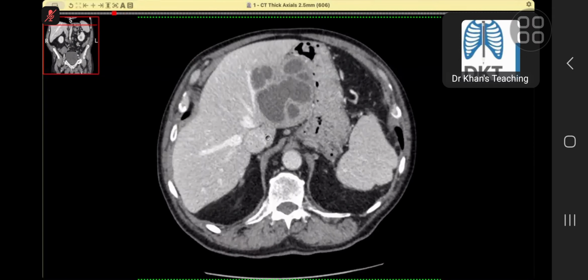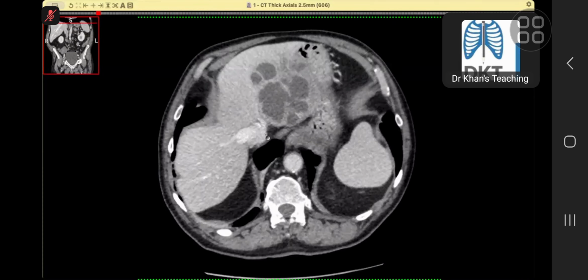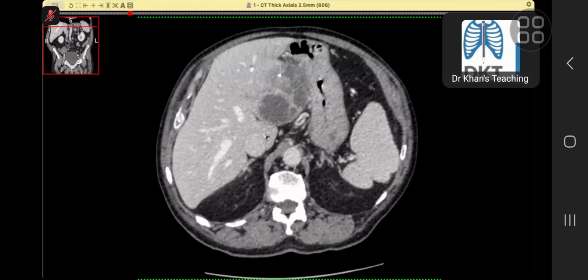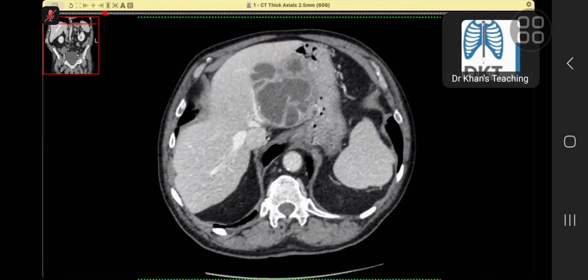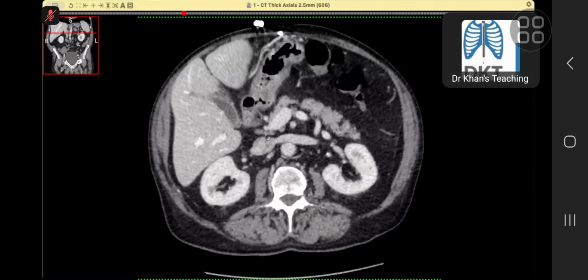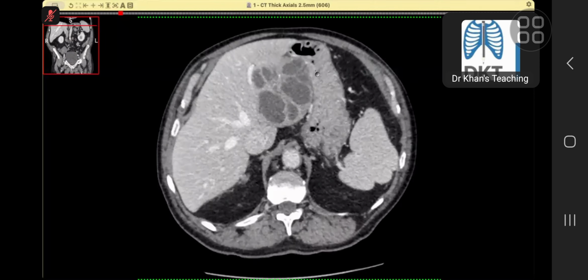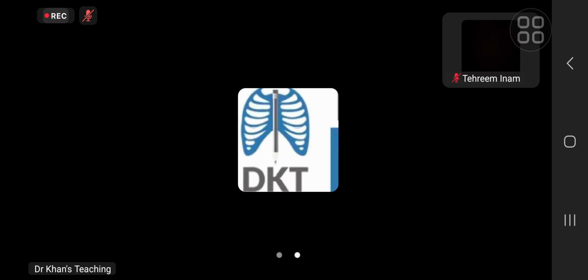Of course, your answer was correct that I will go for an ultrasound guided aspiration to confirm it, and it can also be therapeutic. But I wanted you to confirm it. In the UK, we do MR livers like you do CT scans. Remember, MR livers are done very commonly here. So MR liver is an exam case and you should know it. And the key thing is that in MR liver, just 1 second.